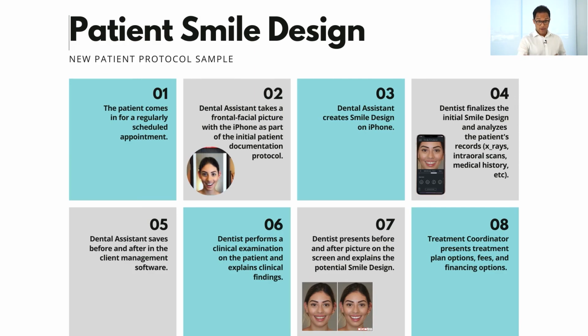You can confirm this smile design with the clinical exams and complementary exams that you will be performing on this patient to then give a treatment option that is approved by the patient and that is facially driven.